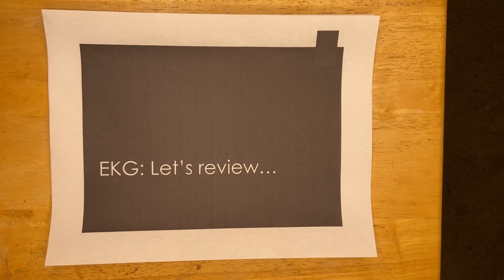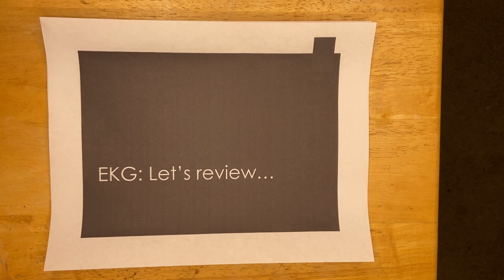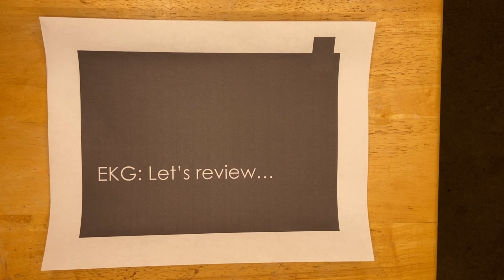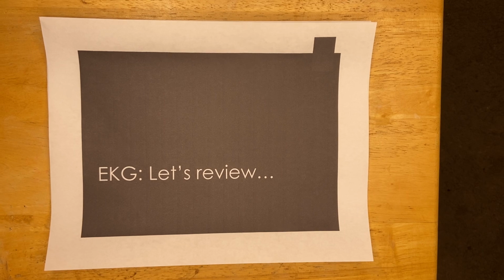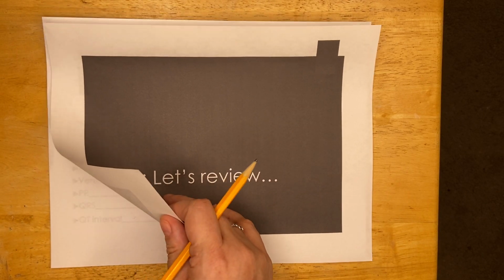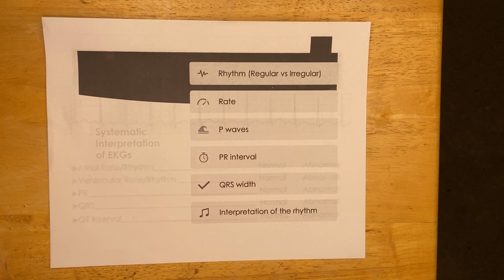I also suspect that the other part of it has to do with trying to do the measurements on the computer screen rather than printing it out. So if you have the opportunity to print out your 50 strip packet, I highly recommend it, simply because it's much easier to measure strips that are in front of you on paper. So without further ado, let's take a look at some EKG best practices for measurement.